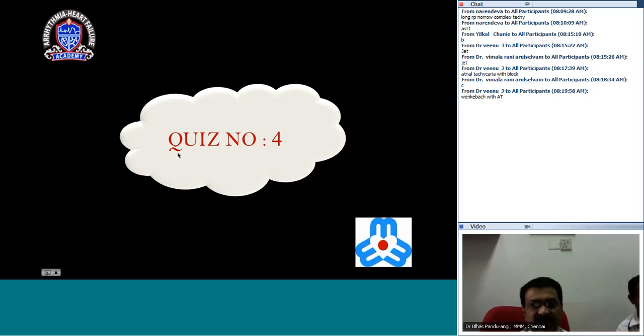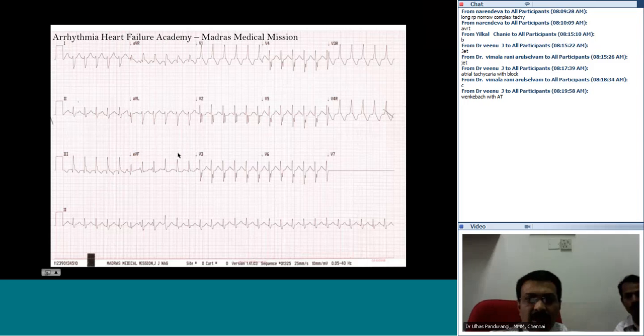ECG. Another pediatric tachyarrhythmia. What you notice here, unlike the previous tachyarrhythmia, is that the QRS tends to be a little wider than the previous ones. It's also associated with rightward axis. You will see that lead 1 shows the negative complex. AVL shows the predominant S waves. So you are talking about a tachyarrhythmia in a baby, right bundle branch block pattern with a discordant axis. Oh no, it's not really a discordant axis. It's a right bundle branch block with the rightward axis.